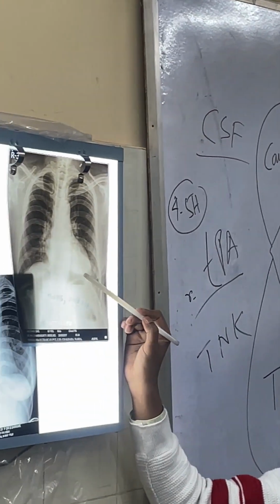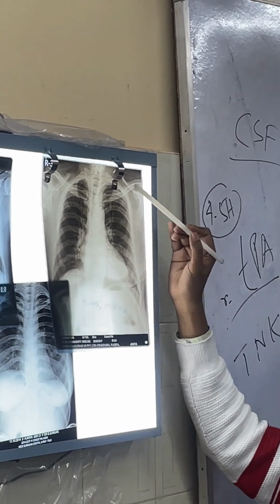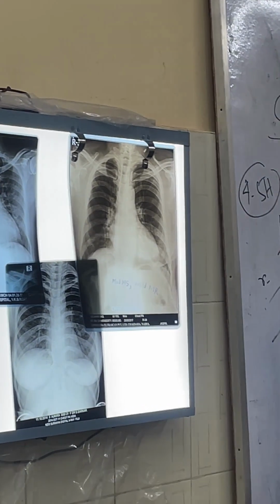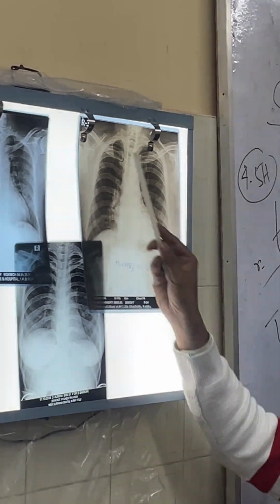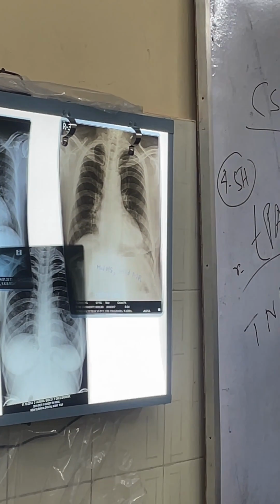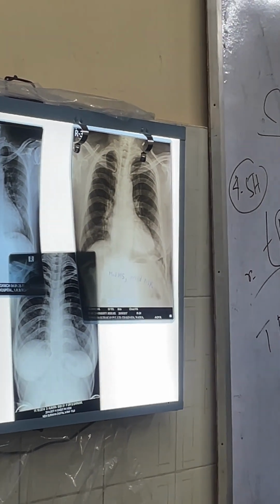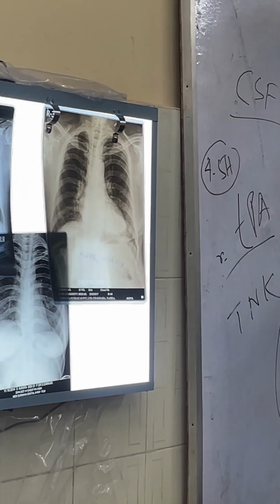So this is the lateral chest, axilla, supraclavicular, and the breast tissue. We have to look at these soft tissue areas. Usually what happens in this soft tissue area is that we can get subcutaneous emphysema. If there is a lucency in this soft tissue area, that means subcutaneous emphysema is present.